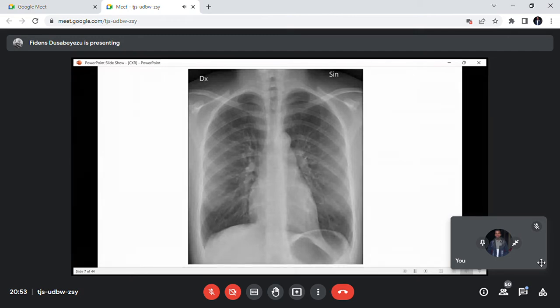And it is where now you can see one lung, the left lung is white, another one is black, because one part of the lung has received much more X-ray compared to the other side. Or the upper part is white, the lower part is dark. So that's what we call angulation, and it happens every day. But when you know it exists, and you know that the X-ray was taken not in radiology, you have to think twice. Don't call it a disease as such, but a technical issue.